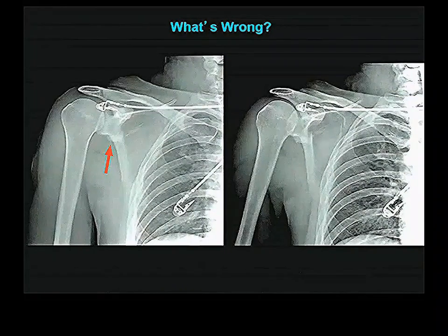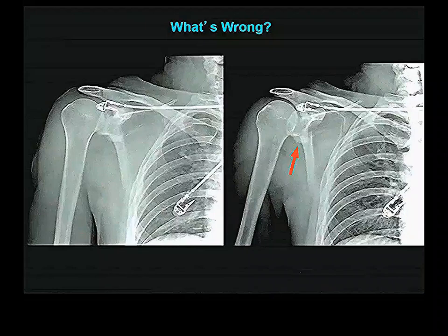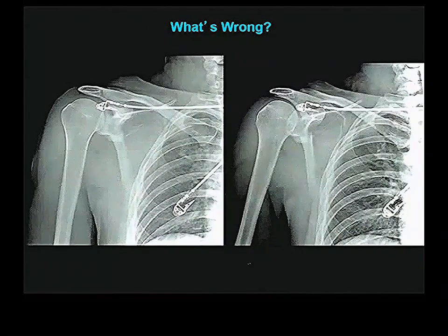You can see this little jog right here. You can see that little jog right there, so that's part of where the scapula is fractured. And you can actually see this little white line and things like that, which is along the fracture line too. Here it is there. So you can tell from this, now that we know that something's wrong, but it's so much better if you can get a CT of this thing, then you can see exactly in great detail how this bone was fractured.